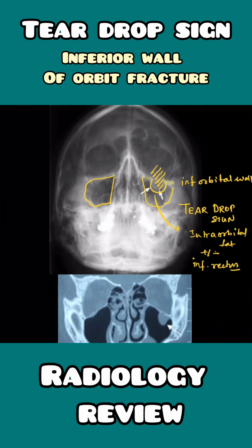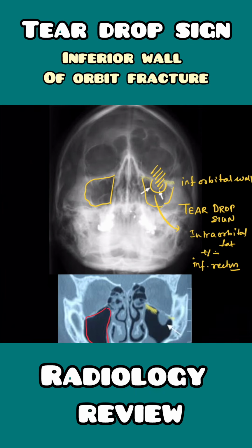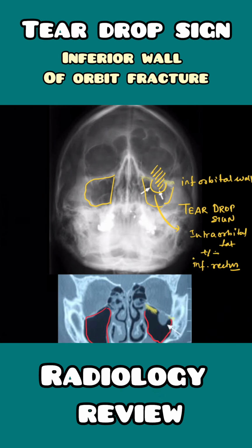The same thing can be very well appreciated on a CT scan, where you can see the inferior wall of the orbit. Over here you can see the maxillary sinus, the outline of the maxillary sinus on both sides, and the herniation of the contents of the orbit into the maxillary sinus, which is again our teardrop sign.